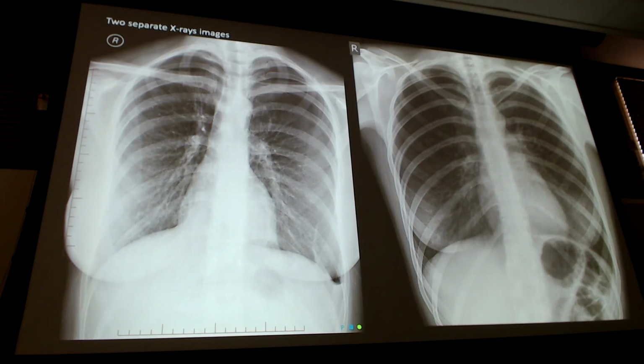Now, on the right side, right here. On this side here, follow it up right there. Kind of comes in. Does everybody see it on the right side? No lung markings up here. None. There's my visceral pleura, and I come up, got plenty of lung markings on the inside. No lung markings.